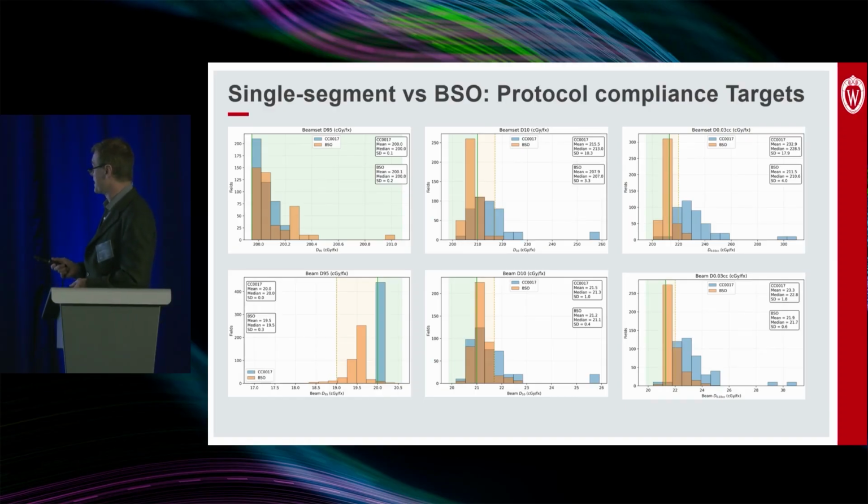This is 44 patients, by the way. I don't know if I mentioned that, but one of the nice things about when you've scripted something up is that you can just load things in sequence, and so I just loaded up 44 patients and ran this study on 44 overnight, and came back and then did it again and again and again, and then eventually got results. But eventually, you can get something nice out of it.